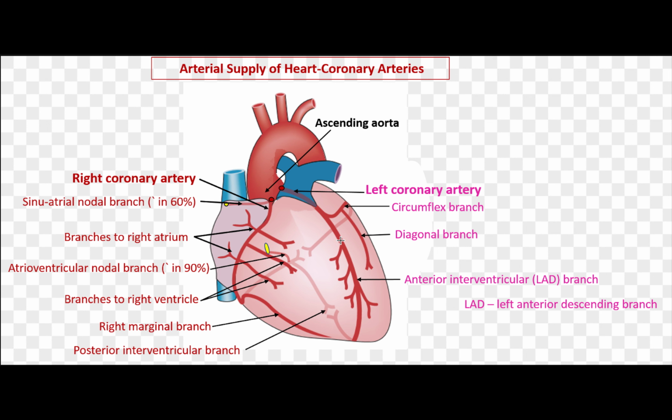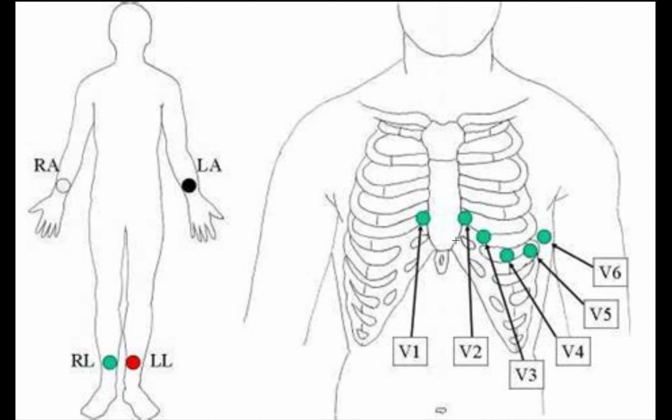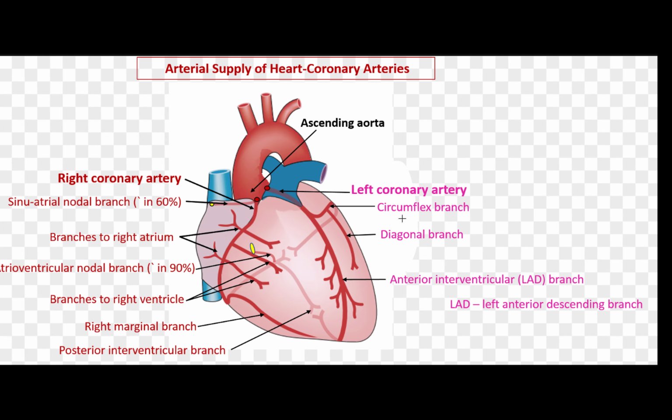So that's why understanding EKGs, especially if there are any changes in that T-wave area, is super important, because it can tell a lot about what's going on in a person's heart, and specifically, where is a blockage happening? Is it happening in the right coronary artery? How far down is it happening? Is it happening in the LAD, left anterior descending, or is it happening in the circumflex artery? And we talked about all these leads, and they're basically looking at different areas of the heart.